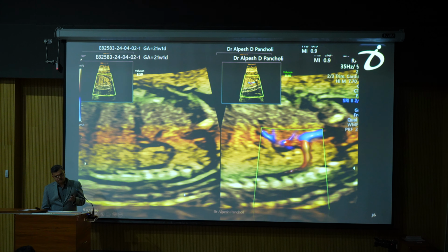Coming to case 5, here this is at NT scan. The patient came, there is a small omphalocele, heterogeneous choroid plexus with choroid plexus cyst, multiple umbilical cord cysts. This is omphalocele with bowel herniation and multiple umbilical cord cysts. We can see the umbilical vein is going towards the renal vein, and the IVC above the renal vein is dilated.